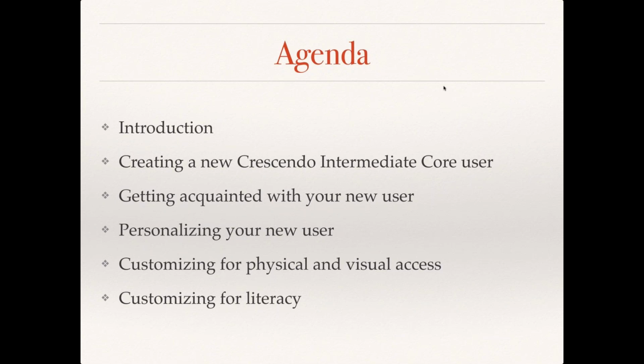We'll make a new user. We'll get acquainted with where things are in the latest version of Proloquo2Go, and then we'll take a look at copying things from your old user to your new user, and something about the personalization process of your new user, so that it will work. It will have the vocabulary that the person you're working with needs to have access to.